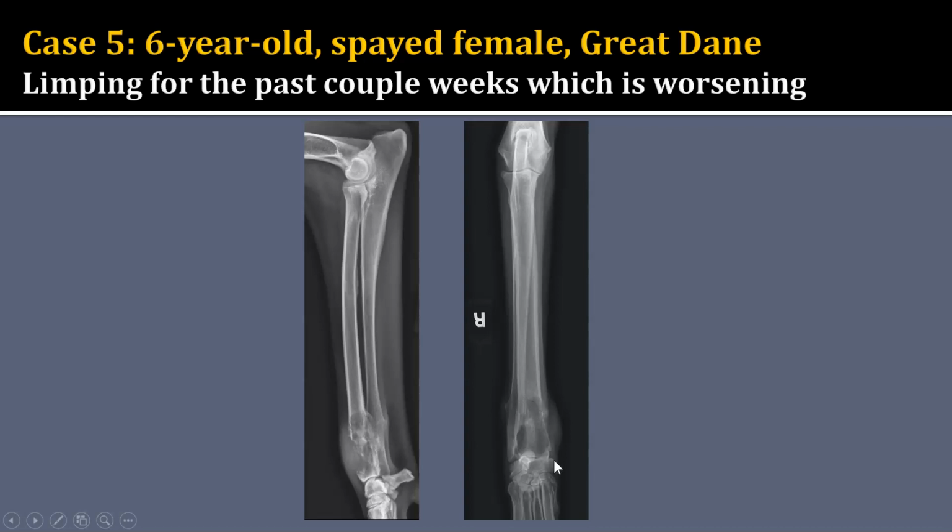It has nothing to do with this other lesion. So this lesion in the distal radius is quite aggressive looking. We've got that moth-eaten lysis, we have periosteal amorphous proliferation, and we have a poor transition zone with additional cortical lysis. So we have an aggressive monostotic, so one bone involved, lesion of the distal radius.